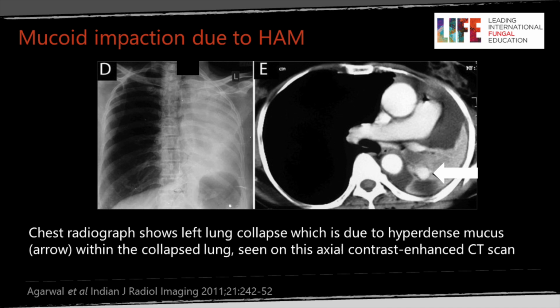The patient may partly compensate for this, but this patient is likely to have a very poor respiratory tolerance. They've lost the whole of their lung. Their left lung is completely collapsed. It's shrunken. The mediastinum and the heart have moved across to the left. You can see that and probably deduce it even on the chest x-ray. But the high attenuation in the bronchus, inside this mucus, makes the diagnosis.